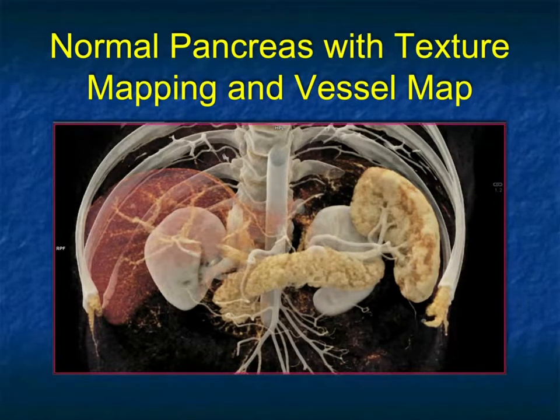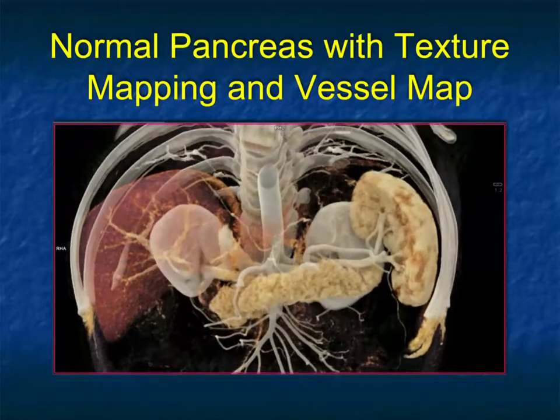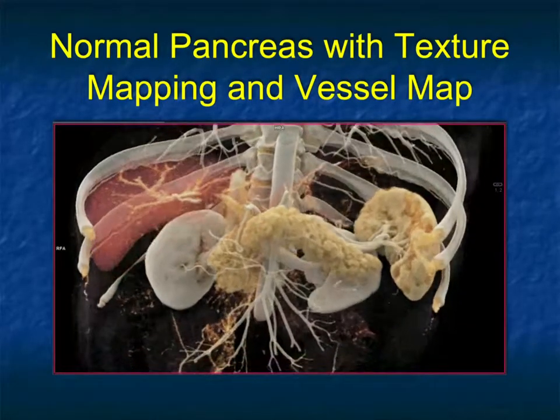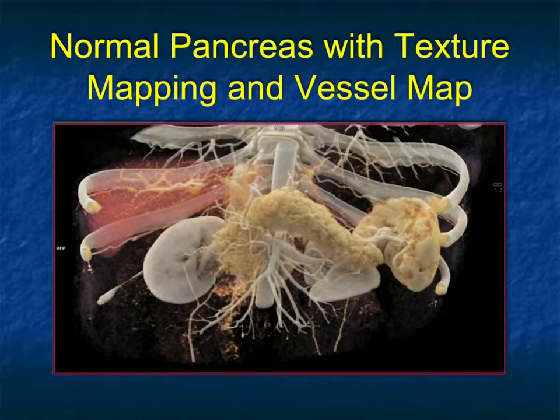Again, I'm going to say that we want to pick up smaller pancreatic tumors. Remember, 40% of tumors 2 cm or less are missed. Well, I want to find those tumors, and I think by doing cinematic rendering, by looking at the earliest textural changes, I'm going to be able to do that. So I think it's very exciting, and you can see it very nicely in this example.